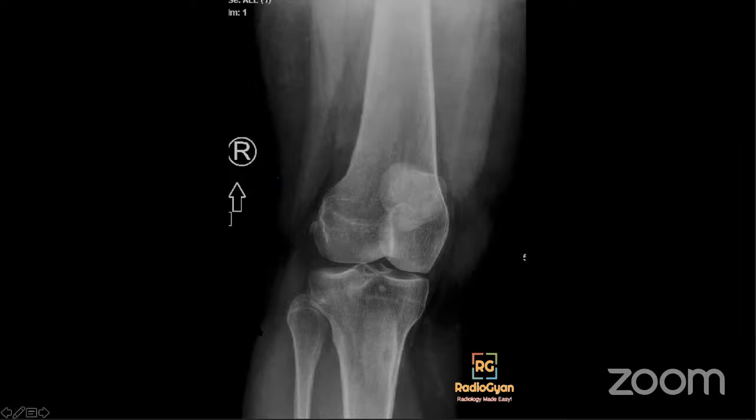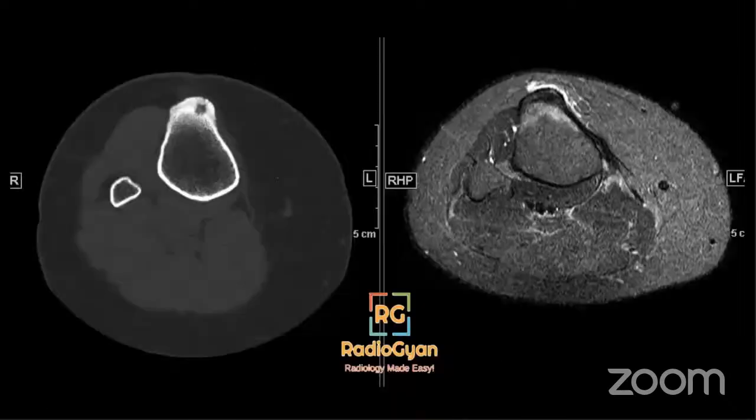So Ruby has rightly pointed out that could this be an osteoid osteoma? So I have the CT and MR axial images for you guys. So again, what we see here is a central nidus, and there's significant sclerosis associated with it. On the CT image, there's cortical thickening, maybe there's some slight periosteal reaction. And on the MR, all we see is edema, which is disproportionate to the size of the lesion. So in a young patient with night pain, the first differential with a small central nidus will be that of an osteoid osteoma, as all of you have rightly pointed out.